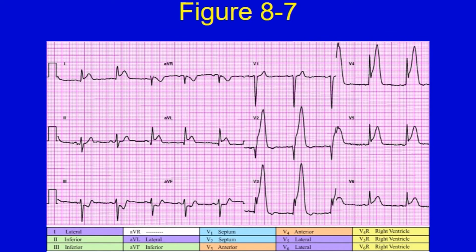That's the earliest stages of an MI. It just picked them up like a string. That's also the ones with ST elevation, aren't they? So you may get there so early that all you see is the T waves in that shape and not any elevation yet.